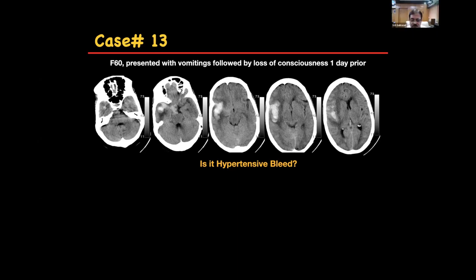The first question is whether this is purely parenchymal or there is a bleed in the subarachnoid system, like the Sylvian. Yes, sir. In the last image we can see it is seeping into the subarachnoid spaces, sir. And there is a much perilesional edema also. Okay. What is this image? The second image? It is into the Sylvian fissure, sir.